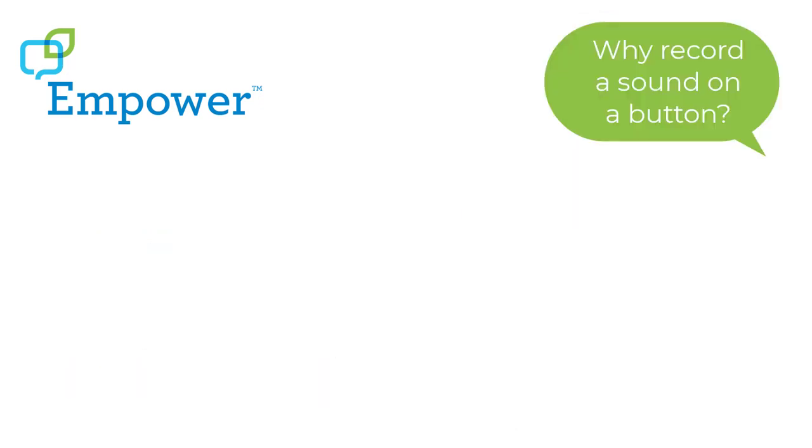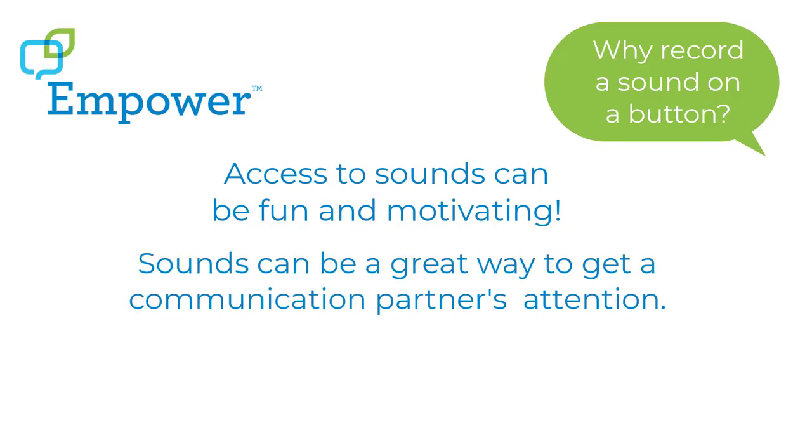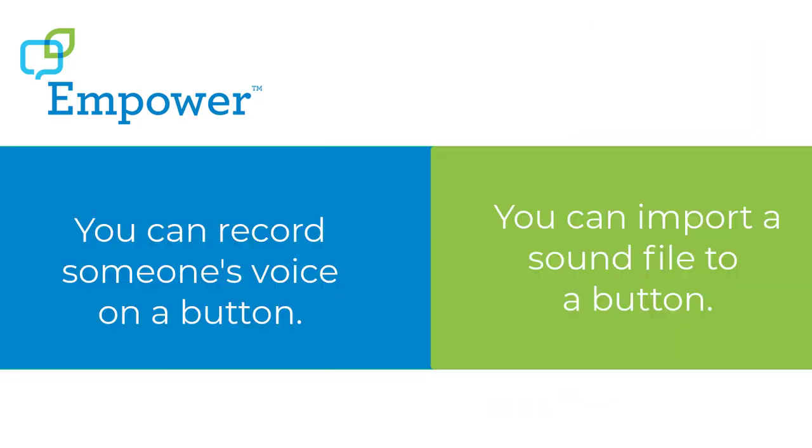Why record a sound on a button? Access to sounds can be fun and motivating for the AAC communicator. Sounds can be a great way to get a communication partner's attention. They can add emphasis and drama to the conversation. You can record someone's voice on a button. You can import a sound file to a button.